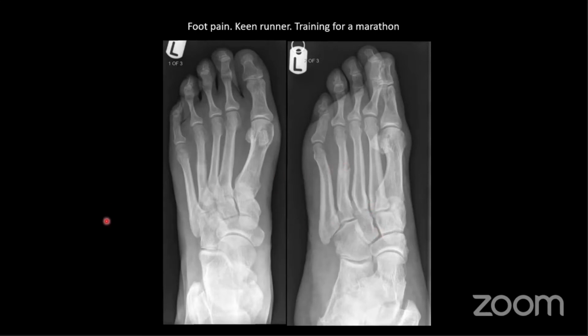But the rest of you have said fourth metatarsal. Yeah, so the abnormality here is a stress fracture. The finding is that there's periosteal reaction around the shaft of the fourth metatarsal here, and there's a cortical lucency probably about here on this film. So this is a stress fracture with surrounding periosteal reaction. So it's a healing fracture.